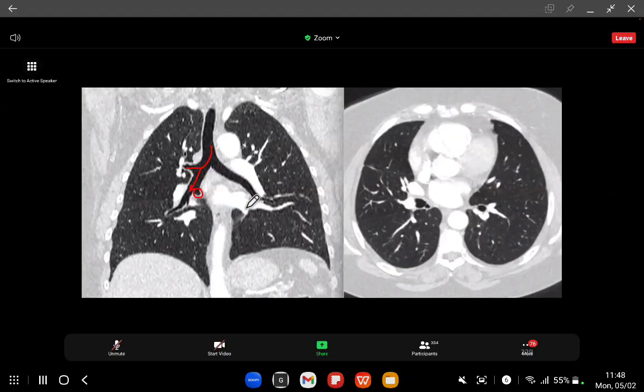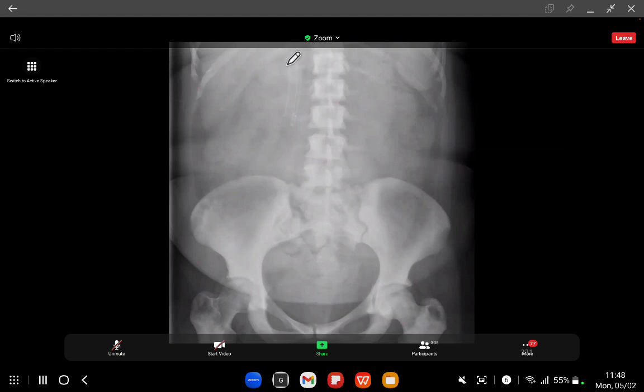What is the cause of the biliary stent? Yeah, Zoe Winston has just answered it. You've got extrahepatic compression caused by intrahepatic metastases. So in other words, the stent is because we've got stenosis due to extrinsic compression due to metastatic liver disease.